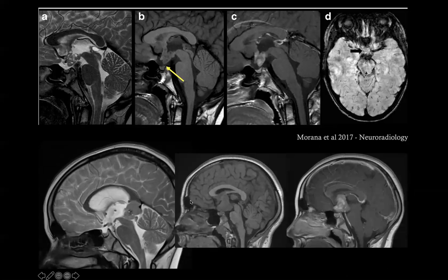So you have this different location. The germ cell tumors can be heterogeneous. Again, Giovanni and colleagues, so Dr. Morana and colleagues, they use SWI and they try to differentiate between different kinds of germ cell tumors, germinoma versus non-germinomatous germ cell tumors using SWI. And despite both of them can have a calcification, the iron content beyond the calcification is more typical of non-germinomatous germ cell tumor. So that's another important use of SWI.